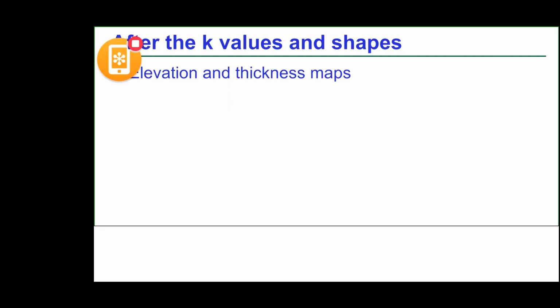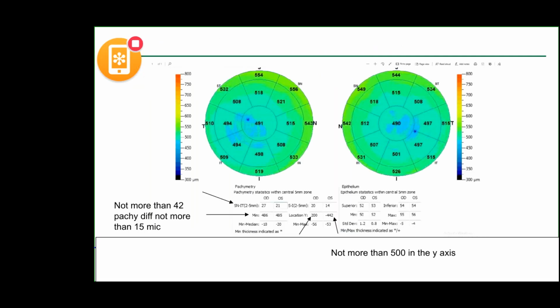So a fat cornea does not mean it is a strong cornea. So basically, you start correlating the thickness with the elevations and the shape and the keratometric values. So let's go into the pachymetric value here. Can you see, this is a corneal pachymeter from the OCT.